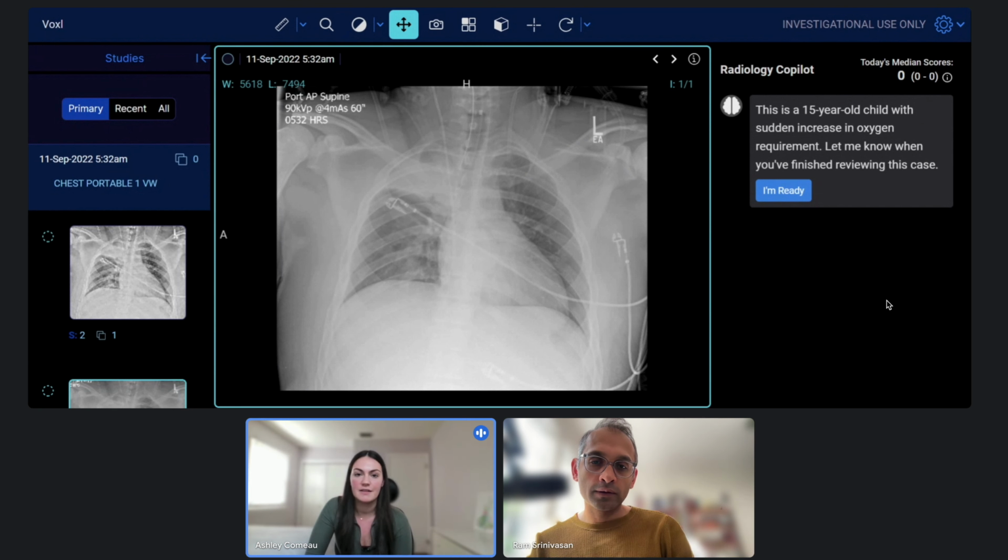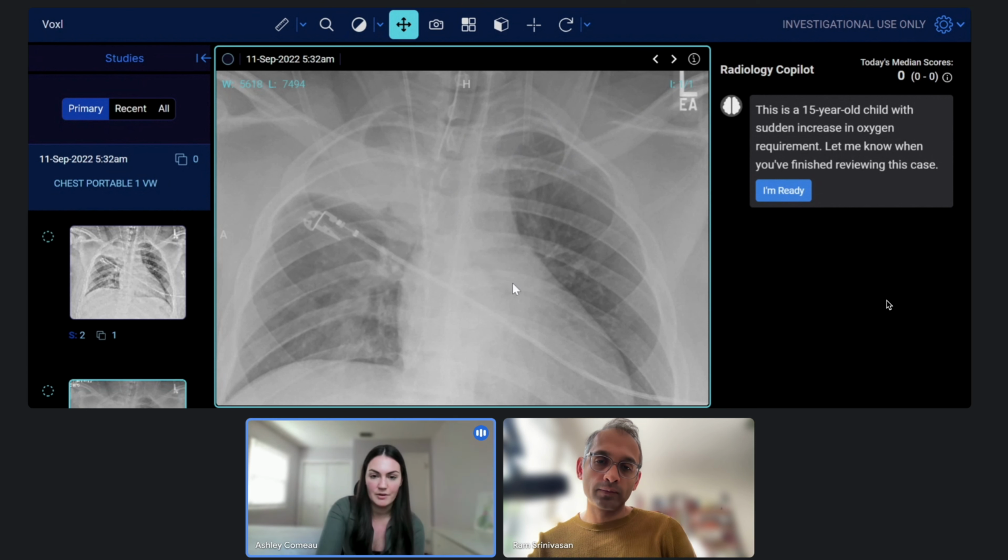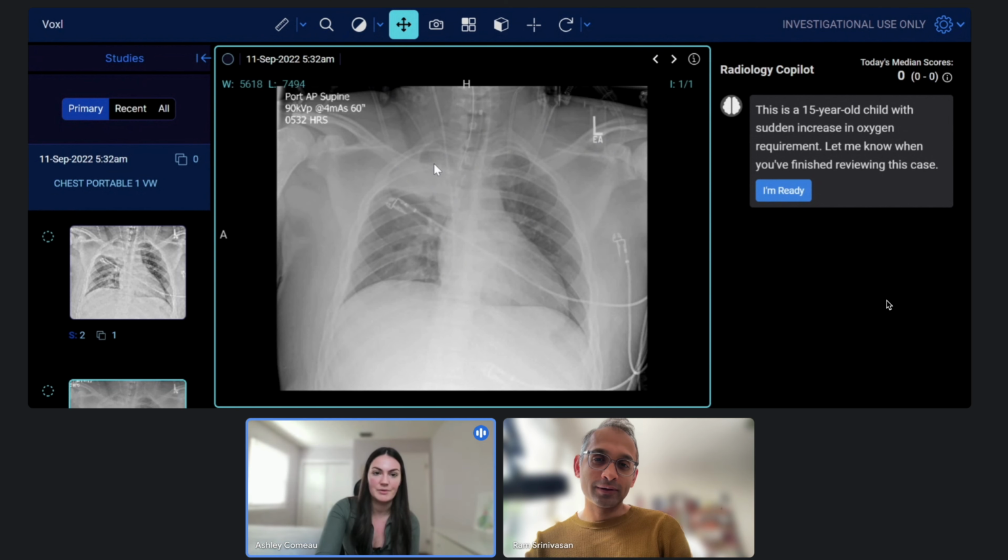For air, you're looking at the airway, the air spaces, and then the vessels that traverse through them, the pulmonary arteries. So I would start with the trachea. So you just want to make sure that it's midline. Here you can see the bronchus stem off here, and then you can kind of follow it back, and I think the carina is right about here. The upper lobe on the right side, you can see there's something going on there. So it could be a collapse there, like a mucus plug causing that.